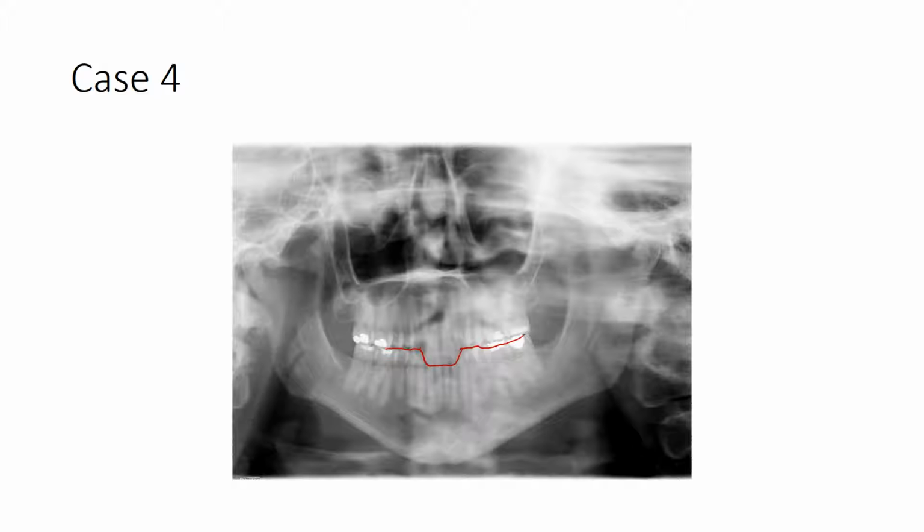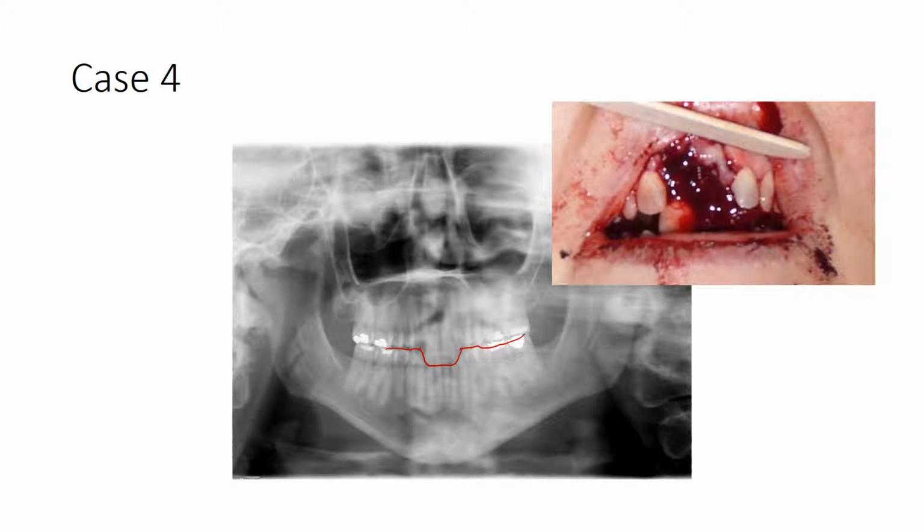And patient clinically looked like this. So this case exemplifies the fact that sometimes you can underestimate the degree of dental injury on panoramic radiographs. Now, of course, this would not be missed clinically, but you don't want to call something normal when the patient actually looks like this.